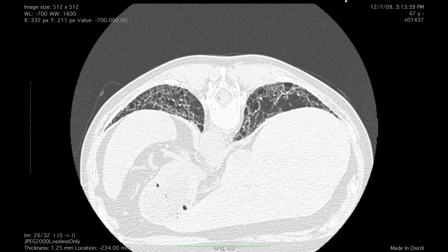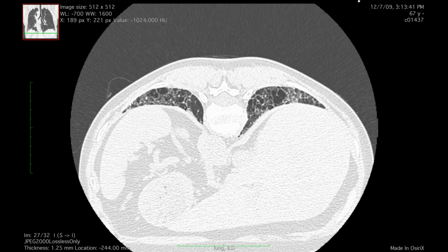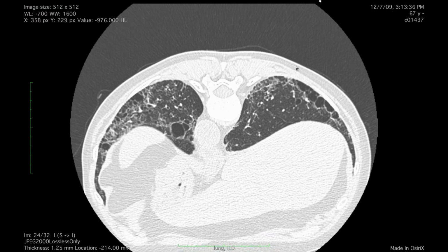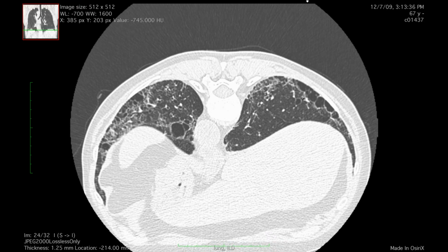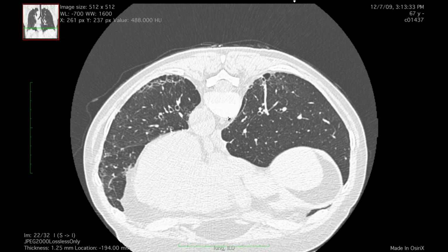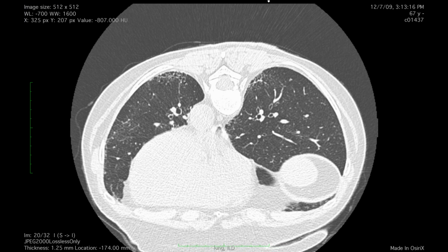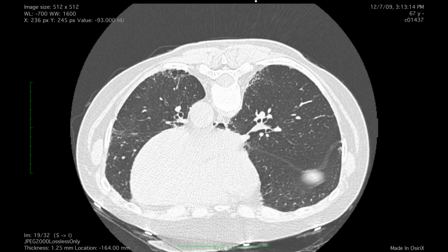I mean, because there's mild fibrosis, not like you see. But some of these you can still see the airways going out, and they're not really that dilated. So it's just okay. But it was really interesting. But that's why she went to path, because there wasn't a lot of other fibrosis. I mean, everything else is pretty pristine. So it's just kind of weird. But yeah. Jeff, were you going to say something?